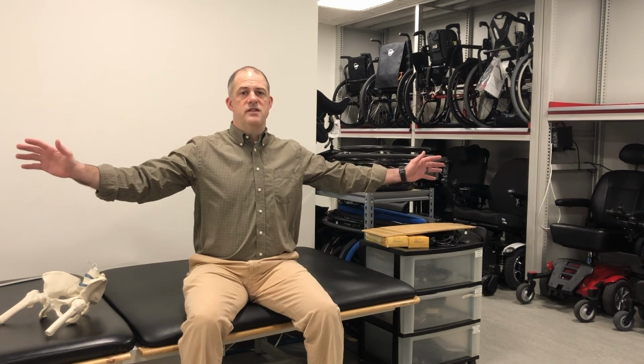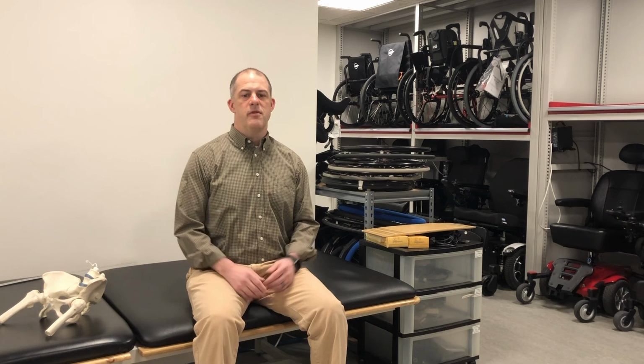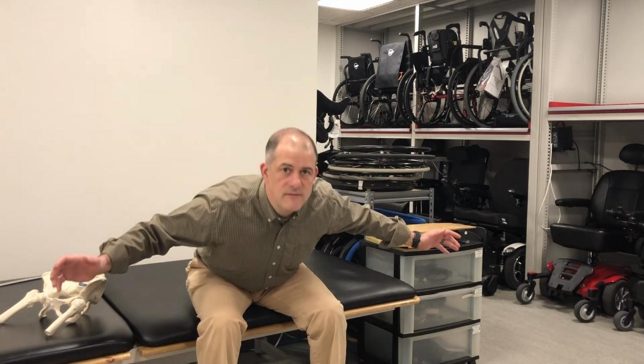Module number 5 focuses on the clinical application of postural supports for comfort, function, and pressure management. Module number 5 is a beast of a module. It covers the assessment process for 3 types of individuals: hands-free sitters, hands-dependent sitters, and prop sitters. Hands-free sitters require the least amount of postural support and can typically perform weight shifts on their own.